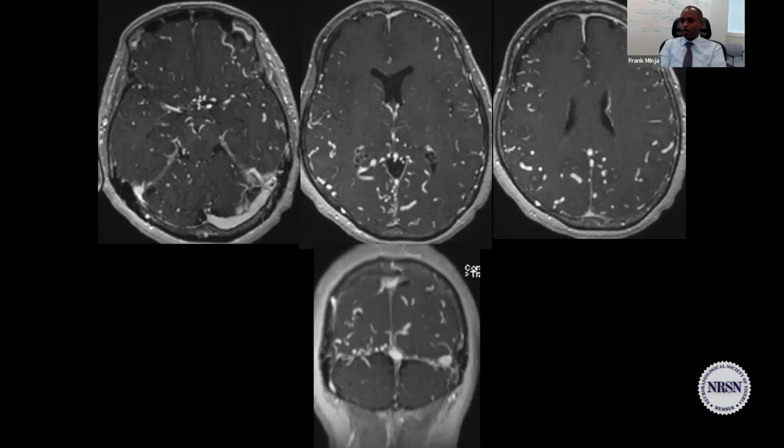Capillary. I had already decided, I'm going to go out of my way. I gave you the answer. If I'm teaching and I give you the two answers, you can't come up with your own answers. Whoever said capillary, you're not even playing along. The choices are arteries or veins.